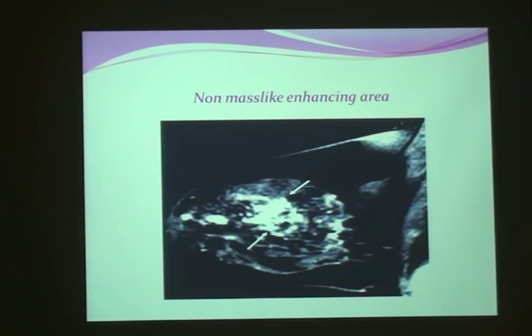We may even, without contrast, just ignore it. Here, after contrast administration, we can really see that we have this non-mass-like enhancing area. It may not be appreciated in pre-contrast images at all, and this is very important to detect. Invasive lobular carcinoma also has the characteristic of being usually bilateral, multicentric, multifocal, and it's really quite aggressive.